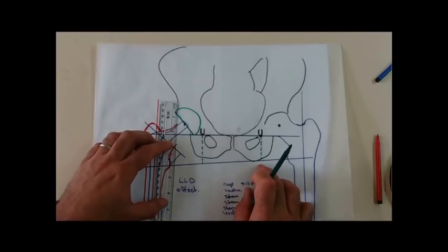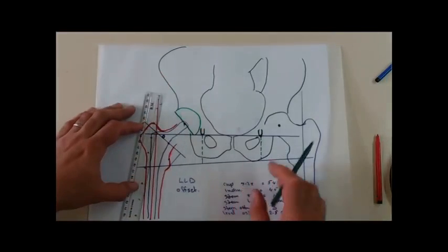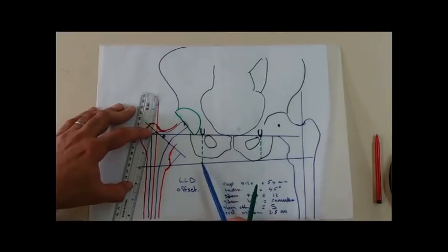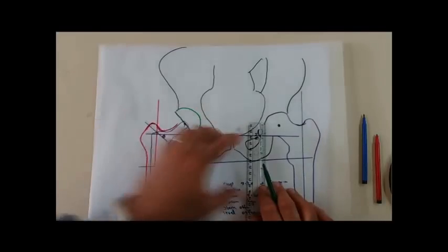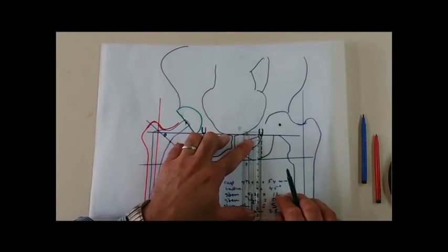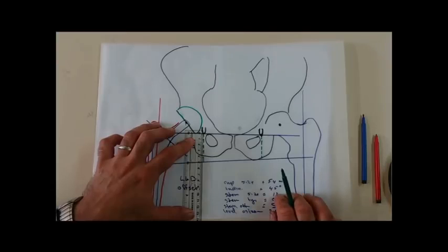If it is more, I have to compensate for this lengthening. For example, in this template, I will end with unacceptable lengthening of the replaced part. To be more accurate, I will measure this to be around 4 cm, while in this it is 5 cm. So 1 centimeter lengthening may not be acceptable.